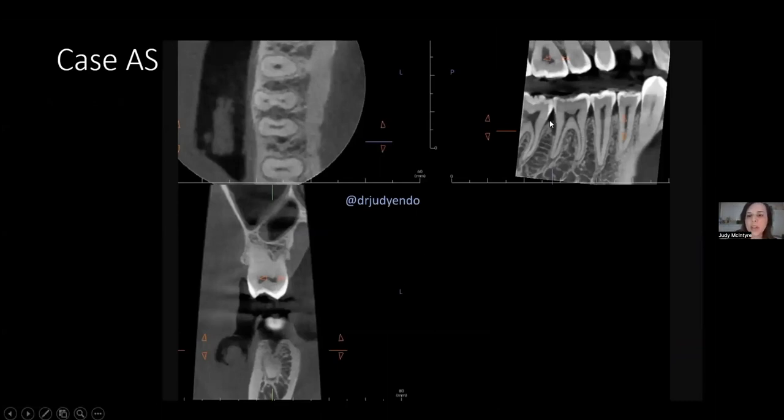This tooth, again, angular defect, a little bit closer to 50% here. So again, a little bit beyond what I like to save, Mickey Mouse ear, bone, bone, bone, Mickey Mouse ear, which corresponds to this angular defect. And again, in the coronal, you see horizontal bone and then that exact divot. So see how my orange line corresponds? I'm at that same Mickey Mouse ear here and that same level right here. So this is that defect there.